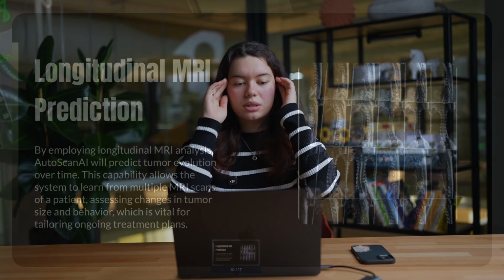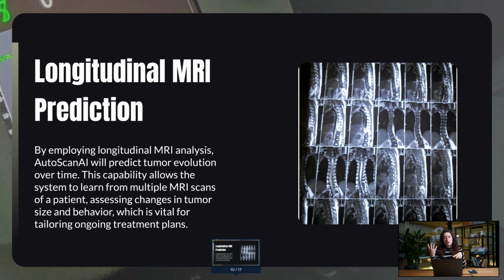Also, I want to do longitudinal MRI prediction, which basically is employing these MRI analyses. I've been thinking that if one patient, patient A for example, has one MRI or multiple, they can be implemented in their own profile. It will be like patient A, 3 MRIs so far. The first one was 3 months ago, and the other one 2 months ago, each one per time. And then I wanted to do some type of prediction for the future.